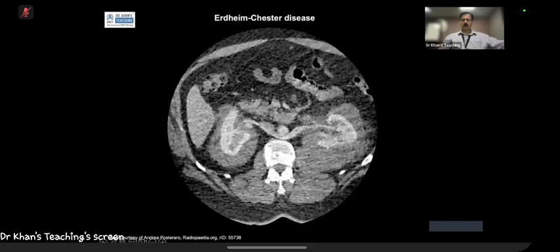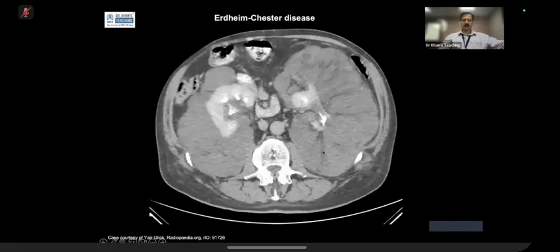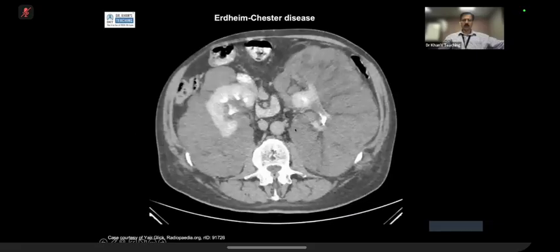Please remember your thought process was good: lymphoma and any hematomas surrounding the kidneys, subcapsular, but this one was different. But your thought process was good. On PET scan, it shows a bit of uptake. This is another case, by the way. And there is a lot of soft tissue around the aorta also. Look at this one, kidney here and a lot of hairiness.